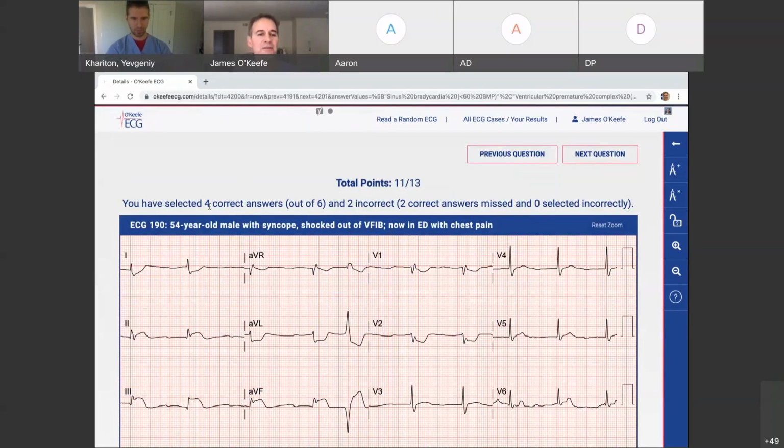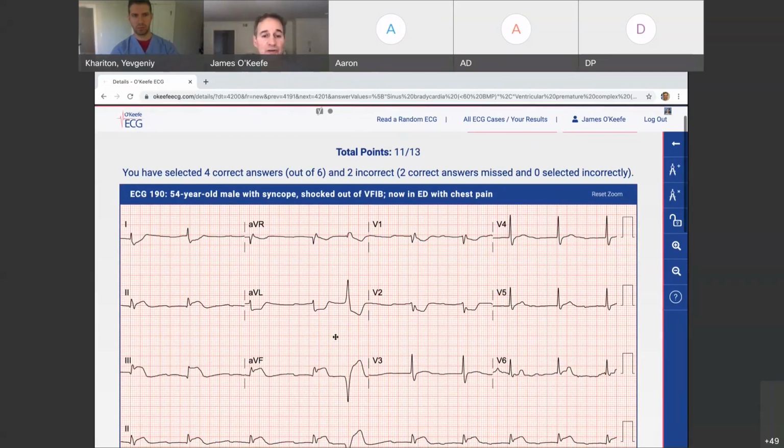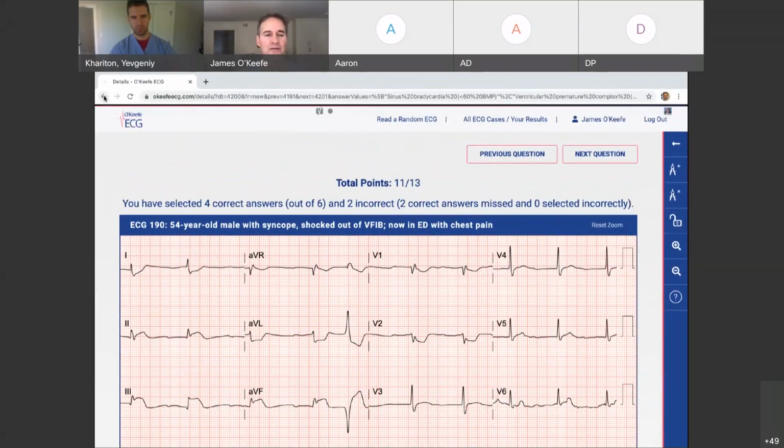And when you see ischemia at a distance, like here, there's ST segment depression over in V1, AVL, you say, well, that's ischemia, or multivessel disease or reciprocal changes. But for board purposes, it's either injury or ischemia, not both. So on the boards, if you call acute ST segment infarction with ST segment elevation, you don't call the injury as well.